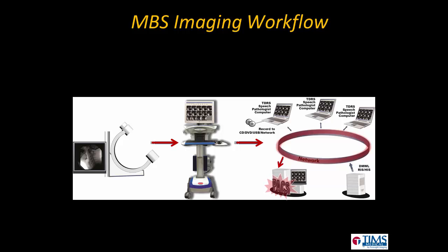However, typically that means that you're tying up the procedure room during that process. Alternatively, each TIMS system includes a copy of our TIMS DICOM review software, which can be installed on a desktop or laptop computer back in the speech office. This provides us with a more efficient workflow that we'll take a look at now.